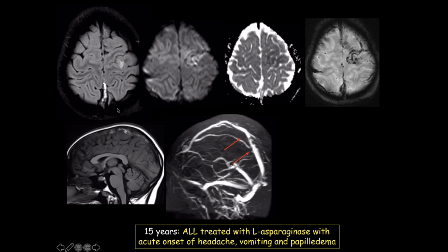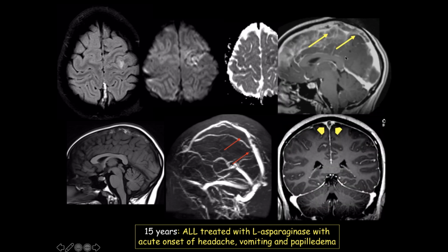What we can see here, unfortunately, is the presence of a thrombus. The thrombus caused suffering, so there's a diffusion restriction for an ischemic stroke of the tissue. Also here we can see the ischemic brain parenchyma, and the blood staining over here. On the other hand, the best way to see a thrombus, as we already said, is a contrast T1.